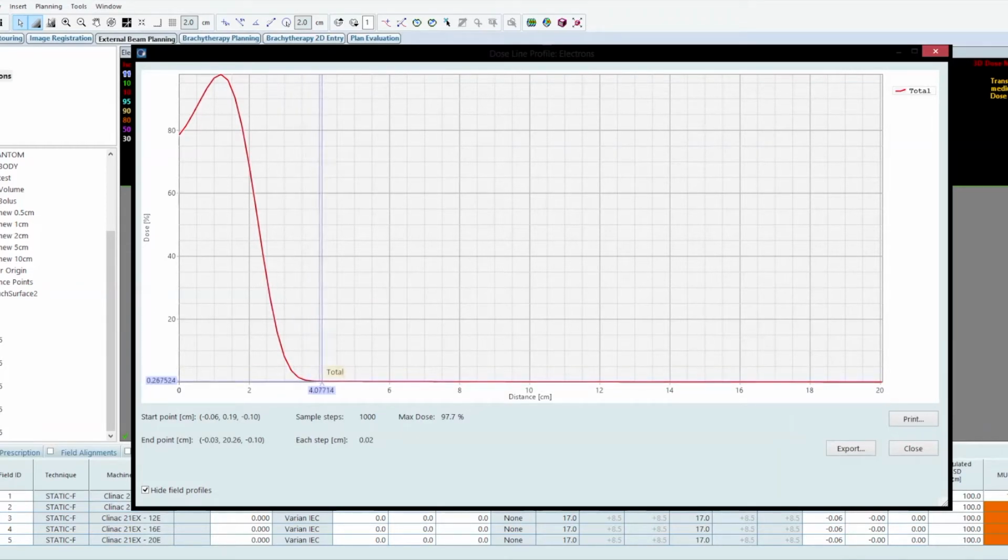The majority of the dose after the practical range of the electrons comes from Bremsstrahlung contamination from inside the treatment head of the machine. And you can see at 6E, my Bremsstrahlung tail, my Bremsstrahlung contamination is less than 0.5%. I'm at 0.2%. And this tail is only due to photon contamination of the beam.